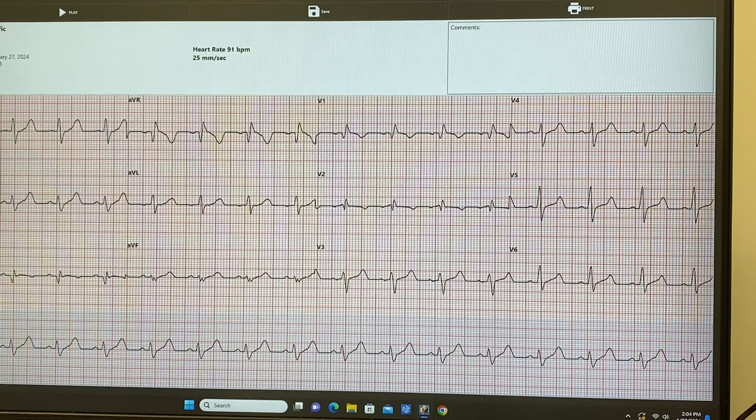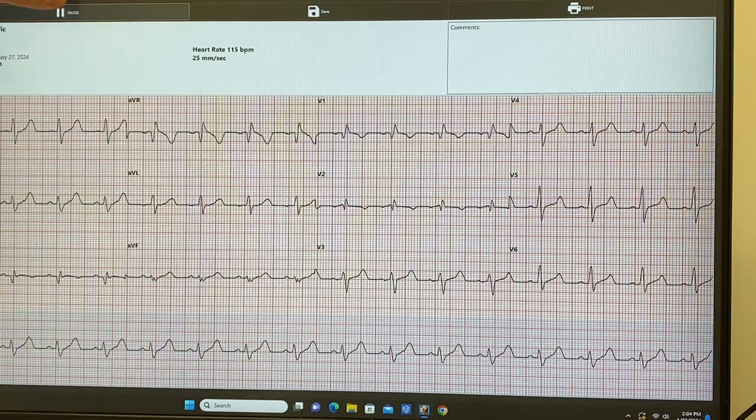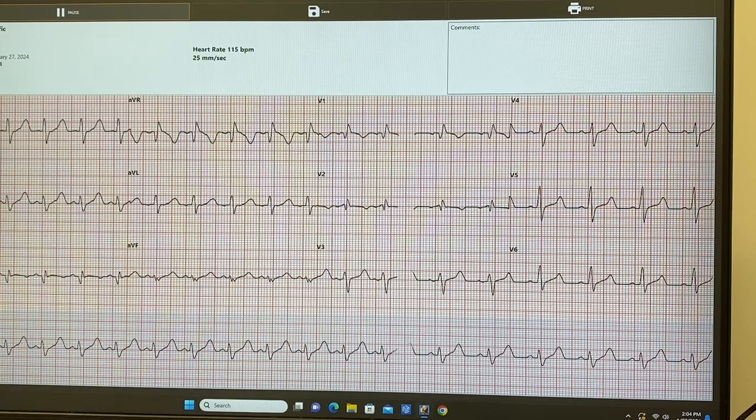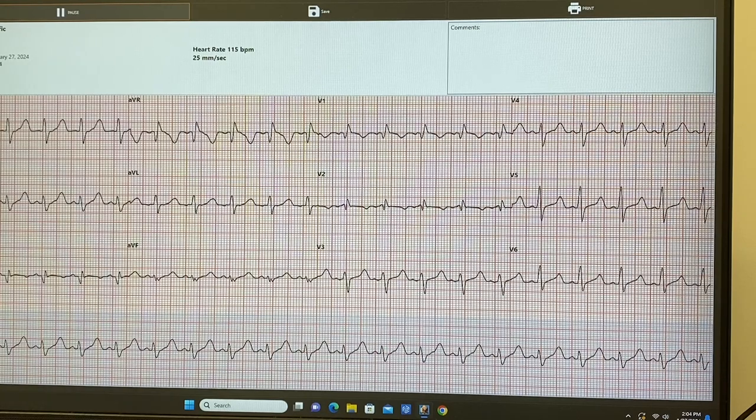Hold on. Play it. Okay, yeah, I'm happier with that. All right, do our steps. You can pause it.